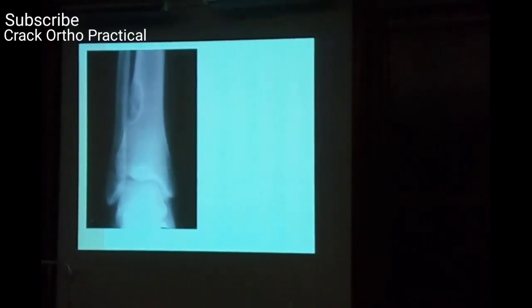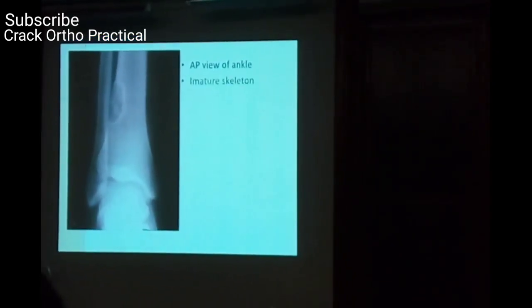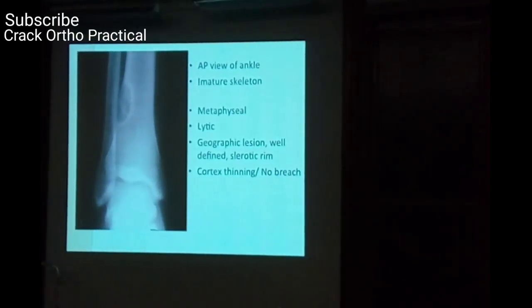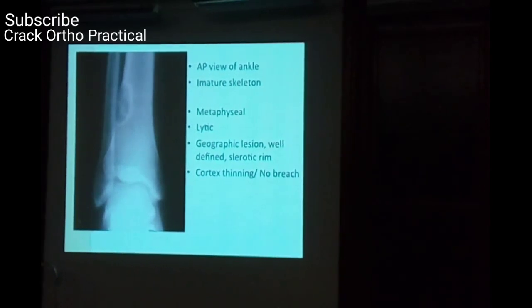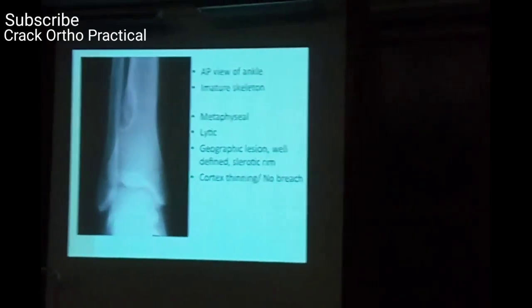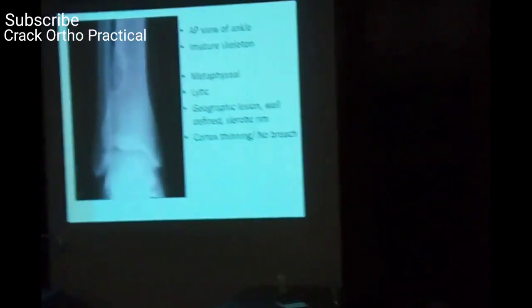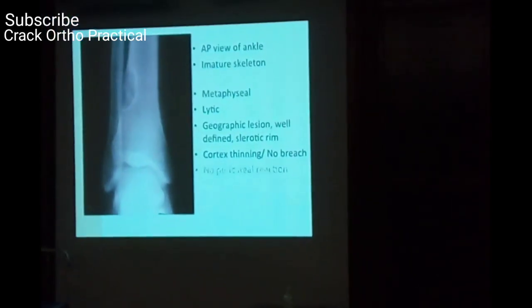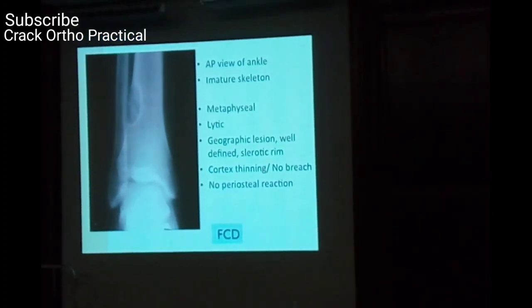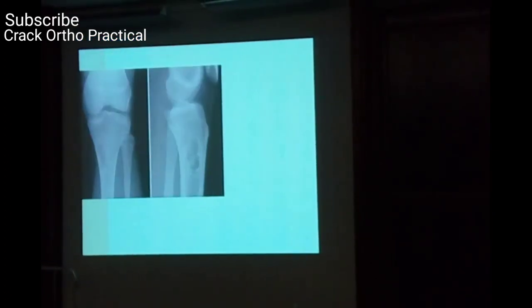Very good. Or fibrous cortical defect. Only thing, what you mentioned is distal end of tibia fibula. Please correct it to the distal end of the leg. You please mention the anatomical area rather than saying it is an X-ray of distal tibia fibula. So fibrous cortical defect it is, but yeah, non-ossifying fibroma can look like that.